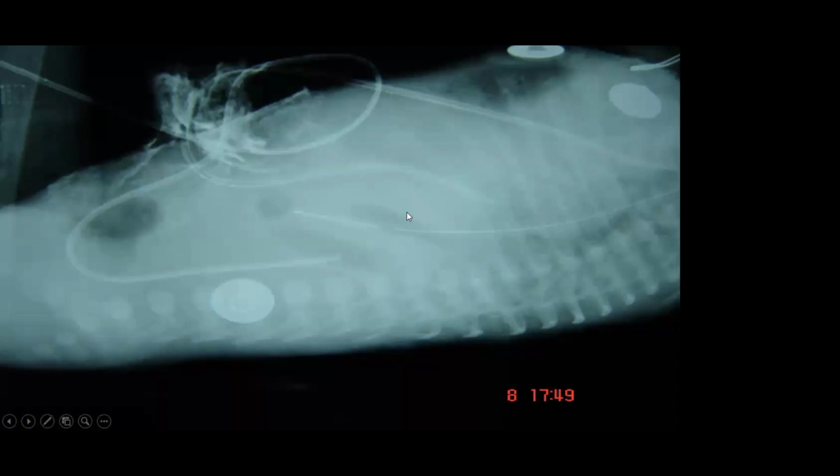Yes, Manan. So when UVC and UAC, the UVC has a curve which is straight above, and the UAC will go deep down, take a loop below, and then it moves forward. So yes, your thinking is perfectly right.